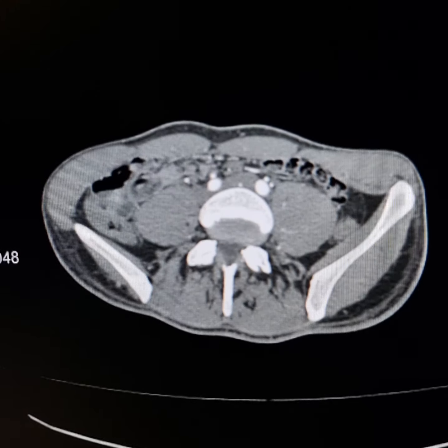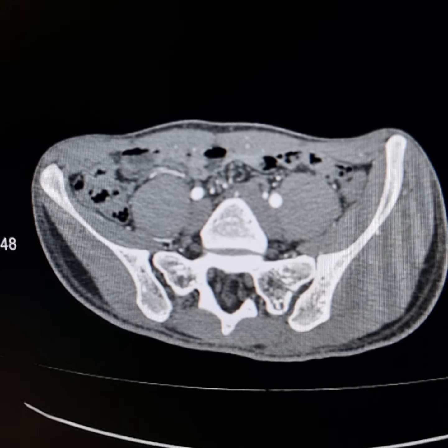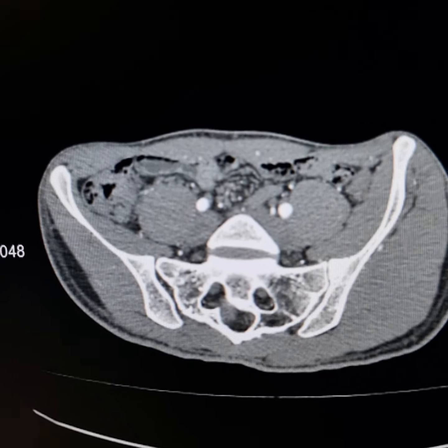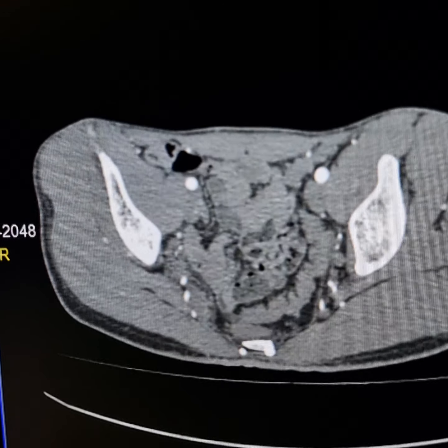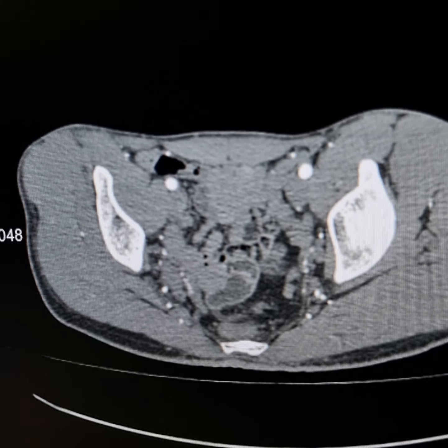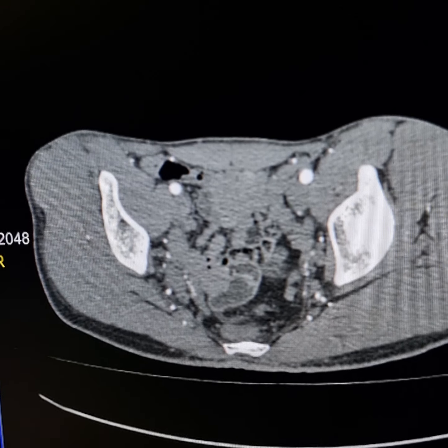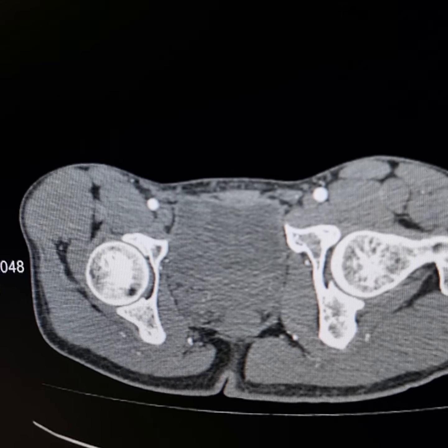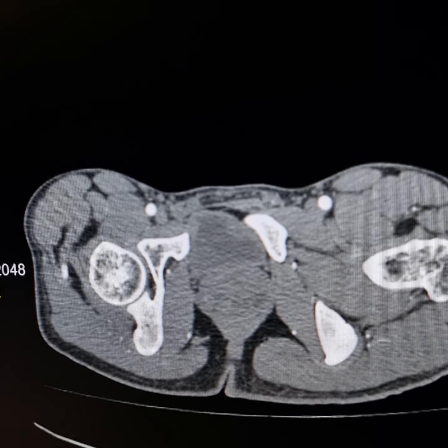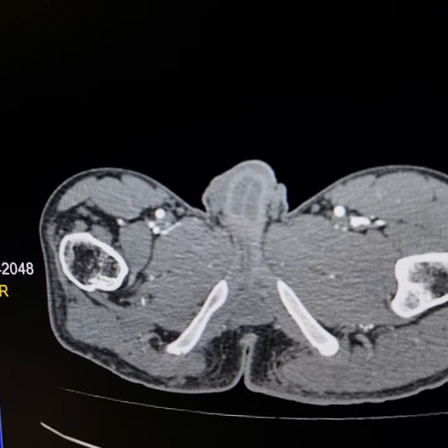The CT angiogram of a young man about 28 years old. He had varicose veins, rather extensive varicose veins along the right lower limb. Multiple sessions of sclerotherapy were carried out, but to no resolve. This is the CT angiogram of the right lower limb.